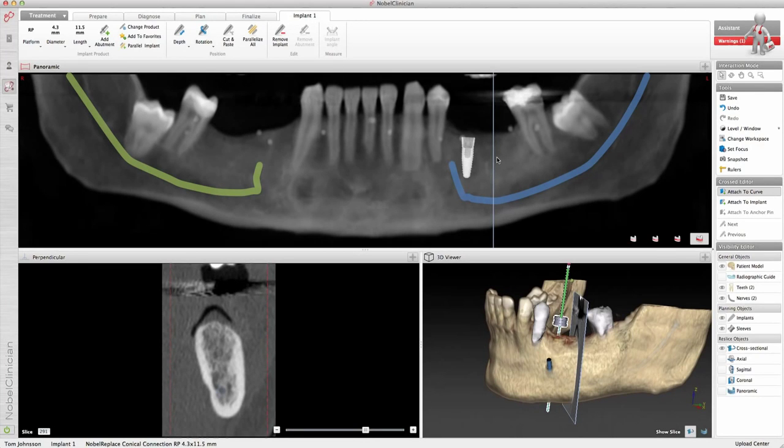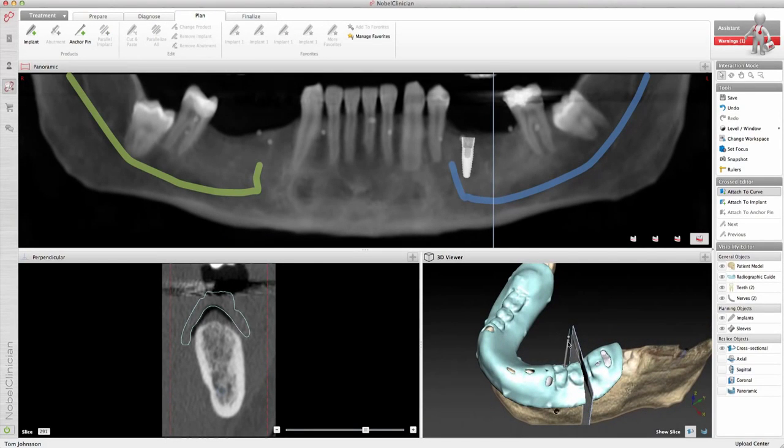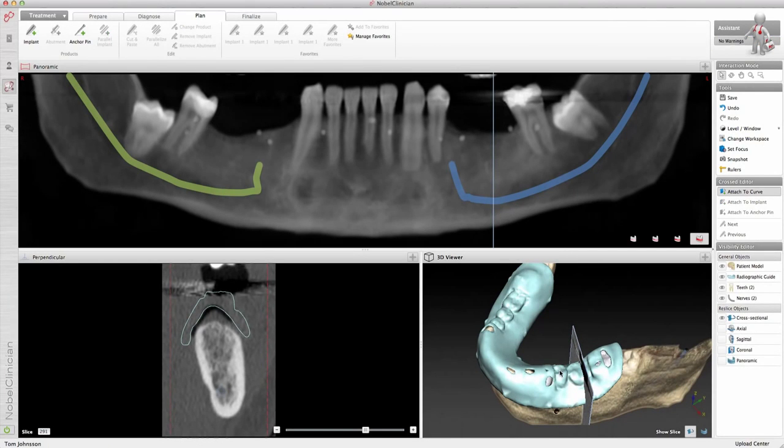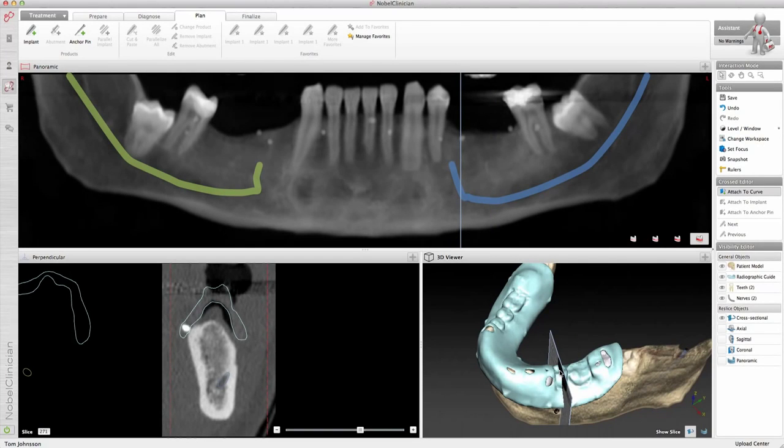In the event that you also have the planned prosthetic situation available, meaning the radiographic guide as your tooth setup reference has been created, the planning process is advised to be slightly different. Now the prosthetic situation will be the start point to define the implant position. We position the cross-sectional reslice where the implant should preferably be positioned from a prosthetic point of view. To do so, use the Set Focus action and left-click at the desired implant location in the 3D scene.